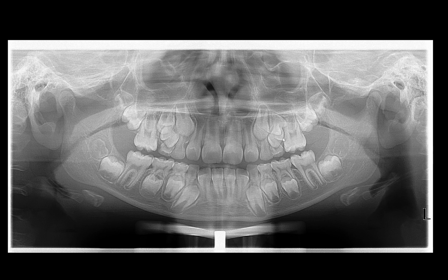And then if you look above these primary molars, you can actually find that there are two premolars, as you'd expect, two permanent premolars, and this is a canine. So we know that there is going to be a rather significant impaction or significant crowding because of the lack of space for the eruption.